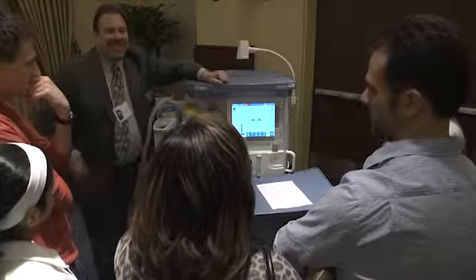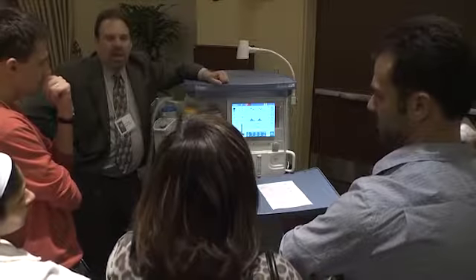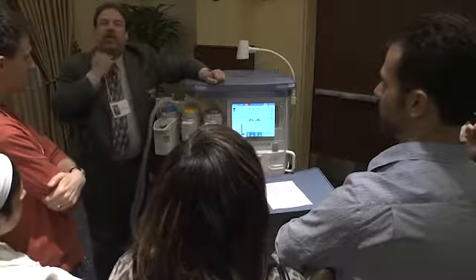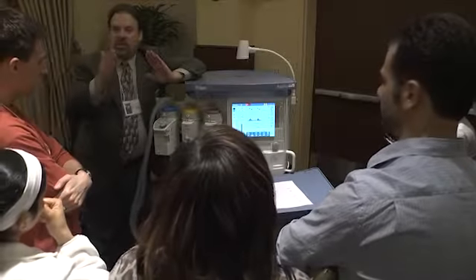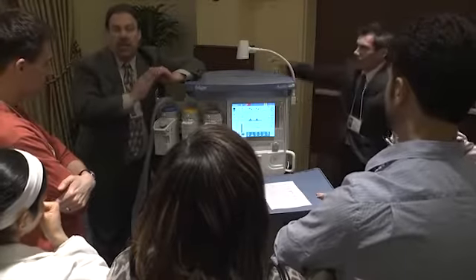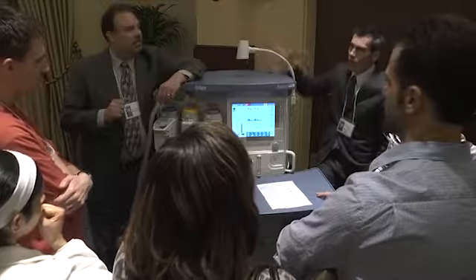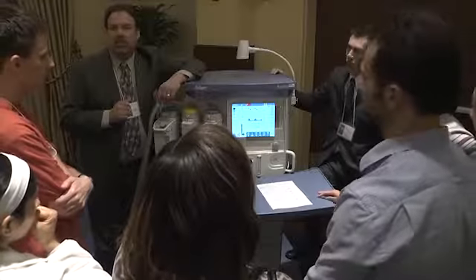Is it basically identifying, since you're in volume control, a patient effort? Exactly right. It's going to trigger the ventilator so that if you've got a set rate, there's a window of opportunity, so when the patient takes a breath and initiates a breath, the ventilator will just cycle with that, so the patient won't fight the ventilator. It's not giving you an inspiratory breath when the patient's exhaling. It waits a percentage of your expiratory phase, about 25% finished, and then it gives you a breath. So it allows you synchronizing.